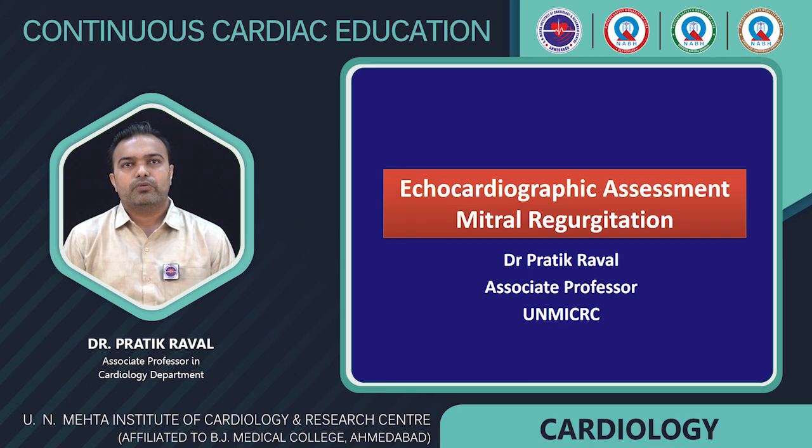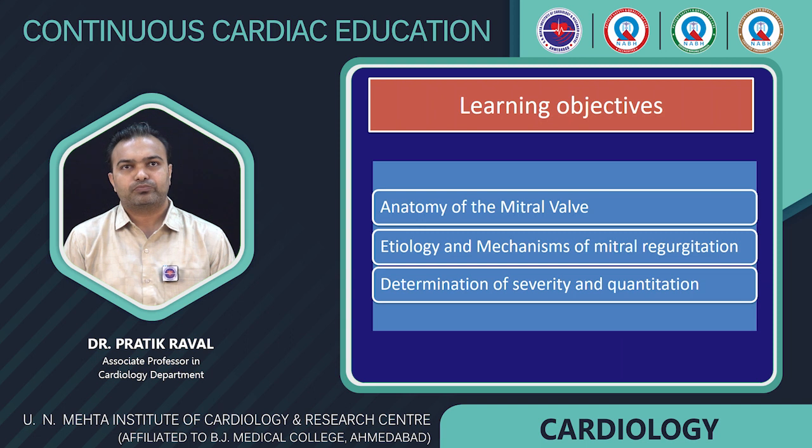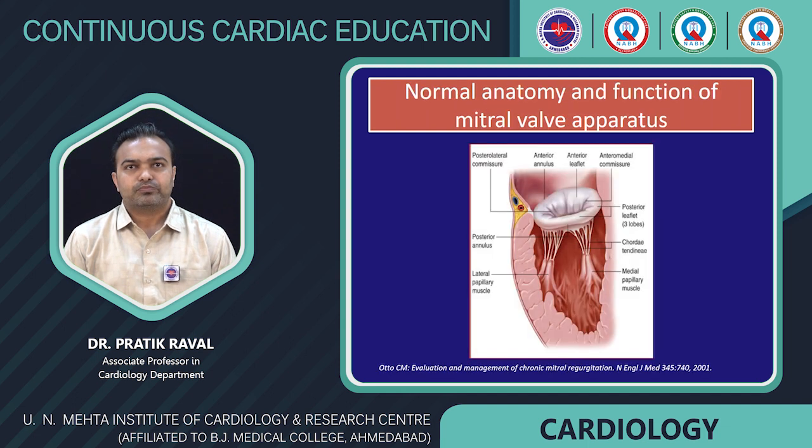Hello everyone. Today we are going to discuss echocardiographic assessment of mitral regurgitation. So our learning objectives will be to understand the anatomy of the mitral valve, to understand the various etiology and mechanism of mitral regurgitation, and to determine the severity of MR.